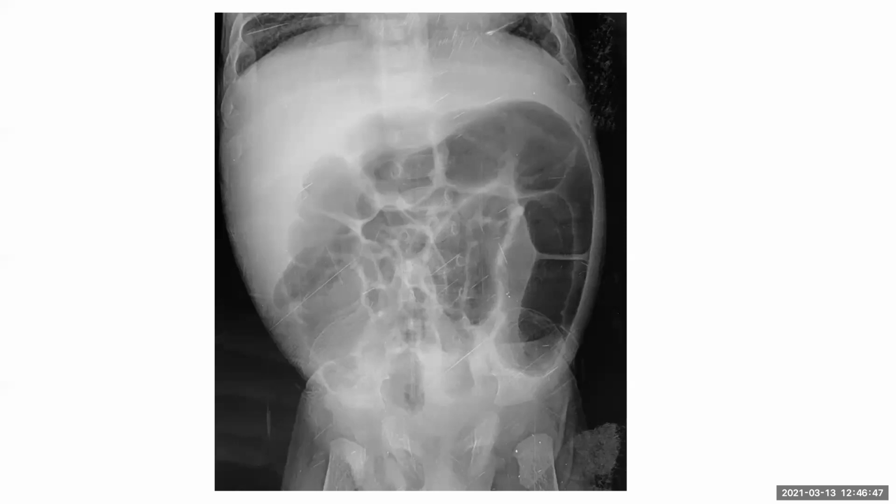I'm looking for any ischemic changes, and I cannot clearly appreciate any pneumatosis. I'm now looking for any gas lucencies present over the liver. I cannot clearly appreciate any lucencies, and I also cannot appreciate any clear rectal gas. So there's no obvious free intraperitoneal air as well.